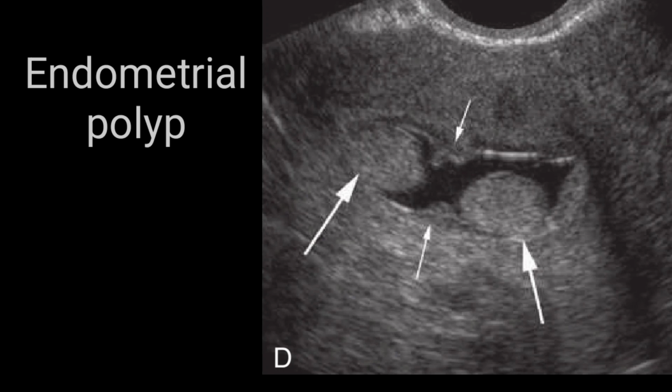So here it is clearly mentioned that these are endometrial polyps, but here you can see one thing which is a great advantage, that is the fluid. If you see fluid within the endometrial cavity, it will help to appreciate small or large polyps within the endometrial cavity. Again, I will explain all these things at length with the topic of endometrial polyps separately.